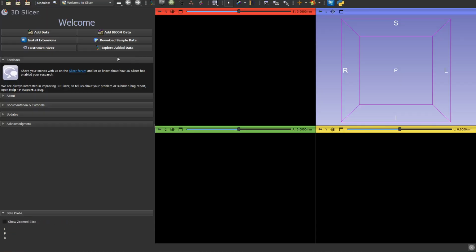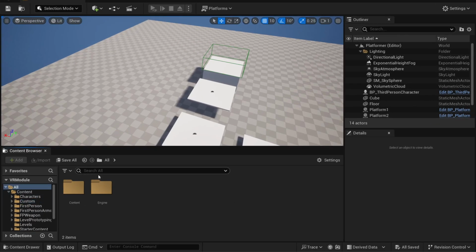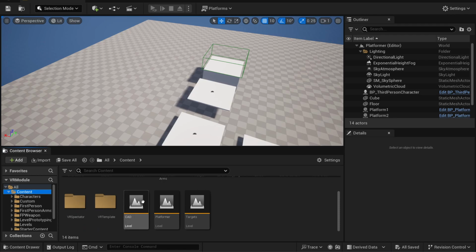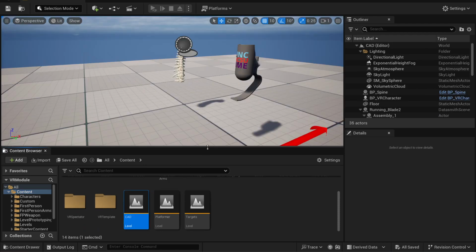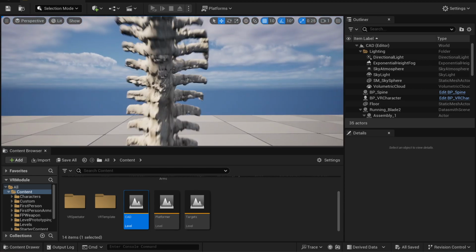Okay, hello everyone. This is going to be a quick demo for the project for today. I could actually show you guys what we'll be doing. So I have my map here. I don't have the VR headset set up right now, but just kind of flying around and looking.